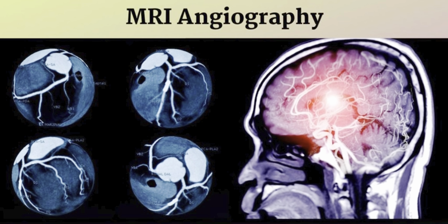Today we are looking at MR angiography of the brain, a non-invasive imaging technique that helps us to visualize the blood vessels of the brain without contrast. This video is designed for medical students, interns and early residents who want to learn how to understand and interpret MRA brain studies, especially in the context of stroke, aneurysm and vascular anomalies.